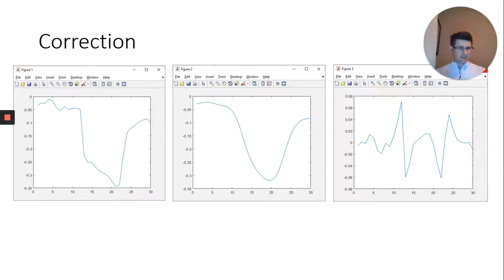Just to give you a little historical background as to why they're called splines: shipbuilders used these curved bars of wood called splines. So we're using these curves to fit the motion, and now we refer to them as splines. It's not some strange mathematical term, it's a shipbuilding term. If you can see it here, this is essentially my model of my motion, and you can overlay it here. You can get a pretty good idea that it's a relatively good fit.